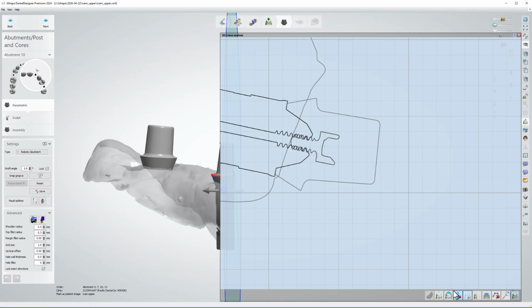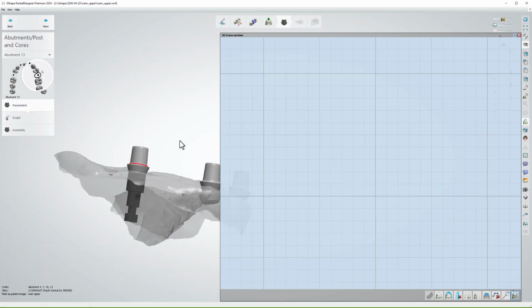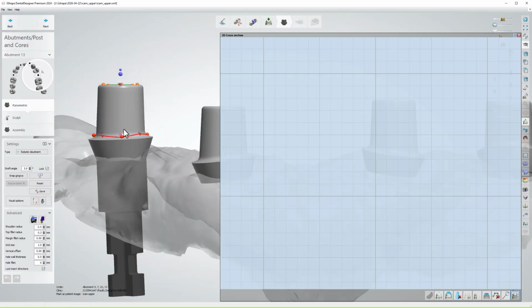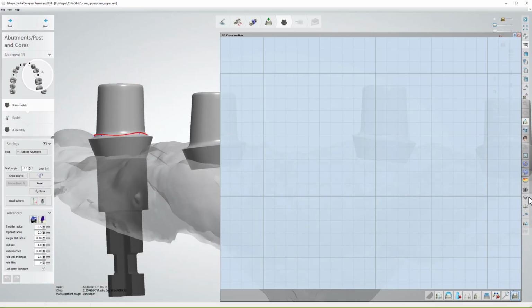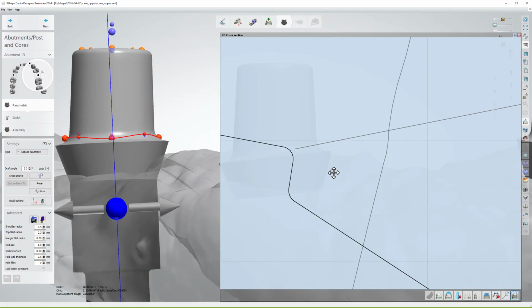Now, what is this guy over here? Let's come over here. This is going to be the Nobel. If you guys want to send it to Nobel to have the aesthetic bridge done and 10-year warranty, you can all sleep like babies at night.